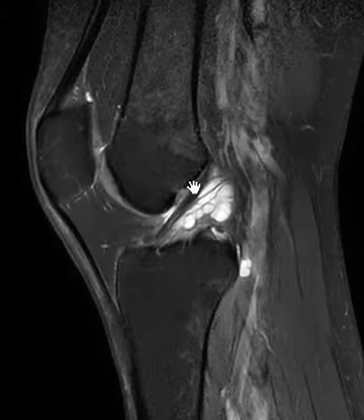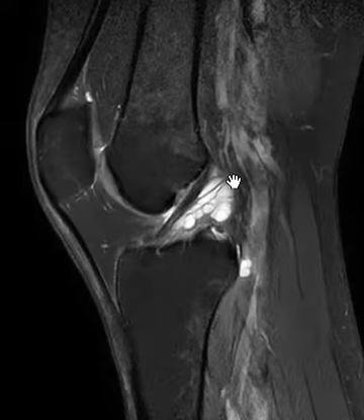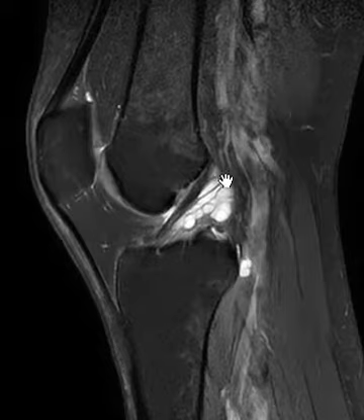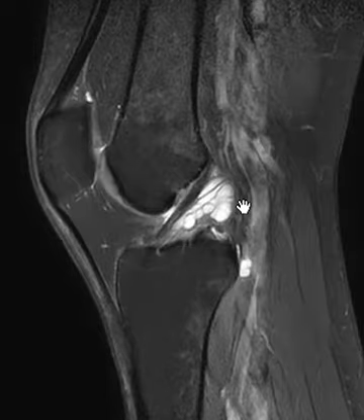In some patients, the ACL will also be foggy, and if you see fluid collection there, you think it may be related to maybe mucinous or mucoid degeneration of the ACL and fluid, this mucinous material coming from that. But in this case, the ACL looks so clean and nice. It's probably just a ganglion cyst from the synovium herniating out. But this is not uncommon, seen in about 1% of people, and oftentimes the patients are asymptomatic.